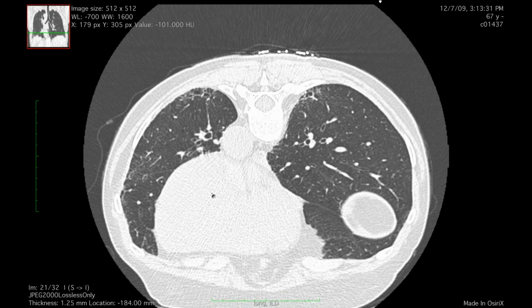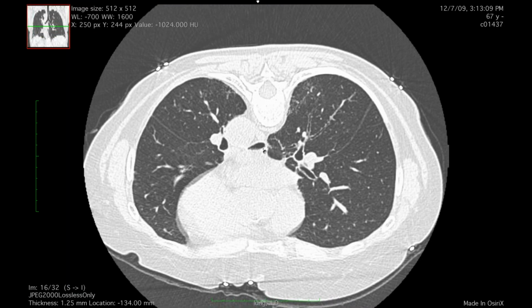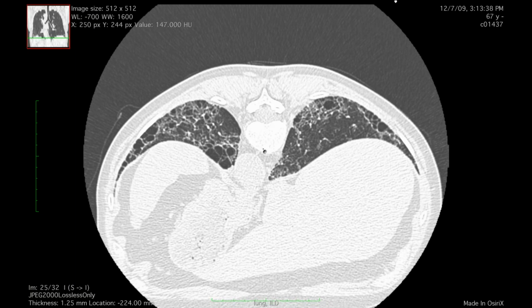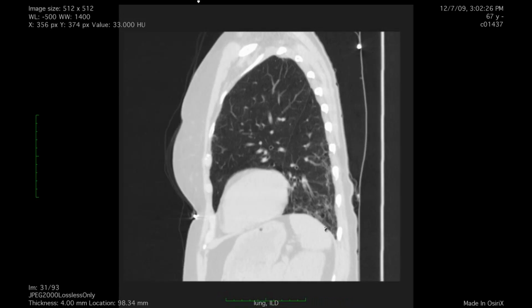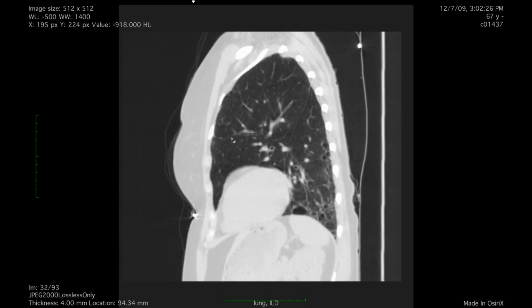I mean, there's some mild bronchiectasis on top of it, and I wonder if it does some sort of damage similar to the elastase. Right. This is just her body's response to chronic aspiration. I don't know. He didn't find anything else to indicate. It's funny because there are some people who say IPF is secondary to chronic microaspiration. Well, and it has the right distribution, right? Like Galvin always talks about, there and there. It's perfect distribution. So I think Jeff, that's a very good thought too.